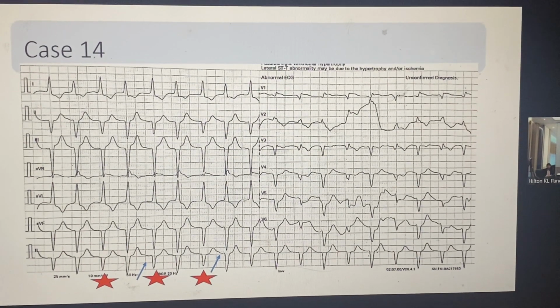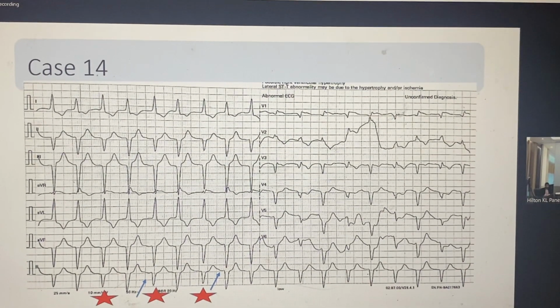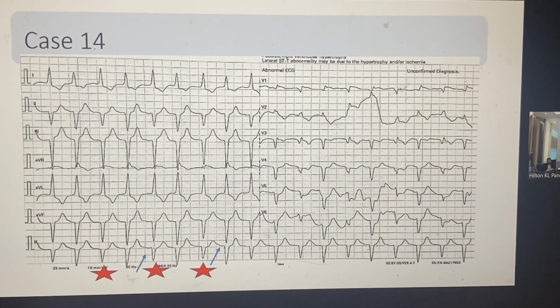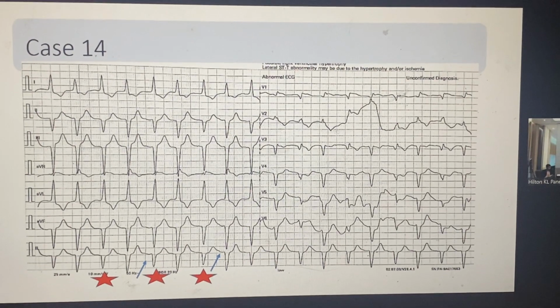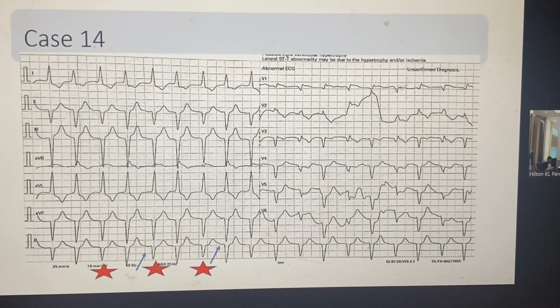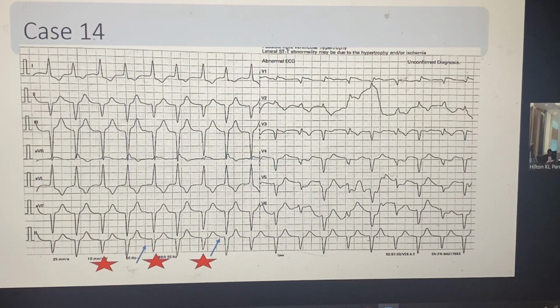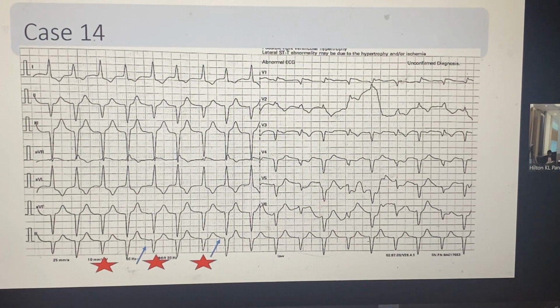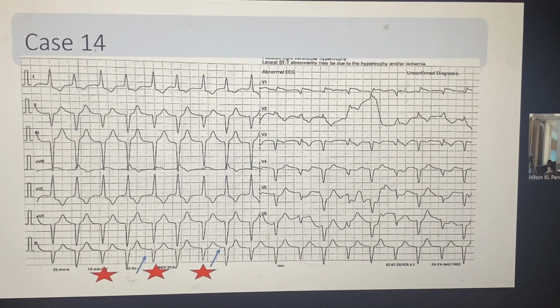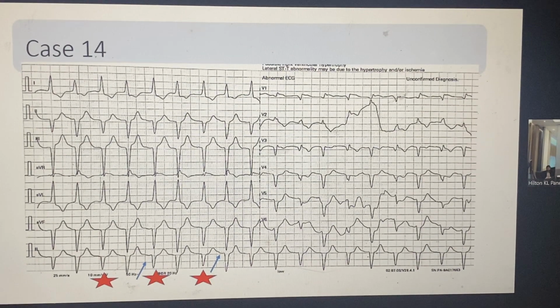Dr. Rizwan mentioned that there is a P wave there. There is dissociation, VA dissociation. So there is definitely more V than A. Okay, AIVR also can behave like this. You can have the P wave, which is fewer in number as compared to the QRS wave. So again, AIVR is, I think, a solid differential diagnosis, looking at the overall picture, and the rate. Yeah, you can have that differential.